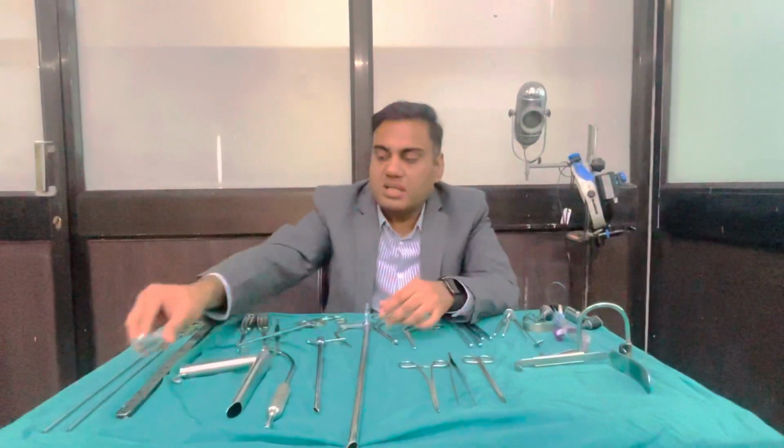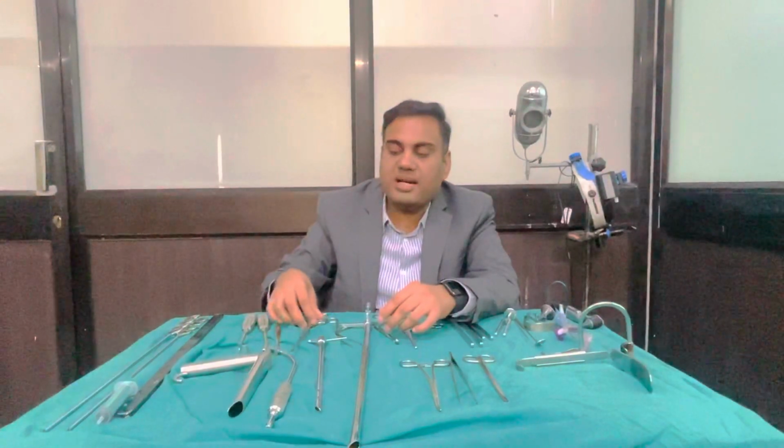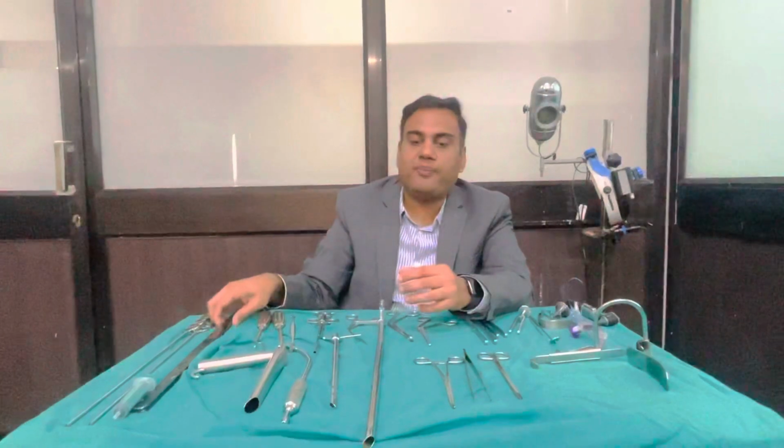After doing scopes and OPD instruments, we are now going to move on to instruments for surgery, and the most important surgery that we at undergraduate level should know about is tonsillectomy. Today we are not going to do the theory of tonsillectomy, we are just going to understand the instrument setup, because it is elaborate and many instruments are required for doing a tonsillectomy.